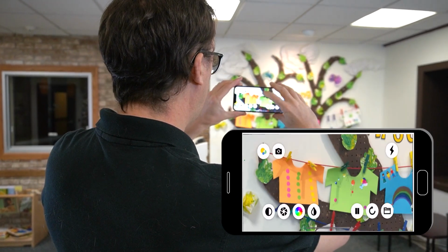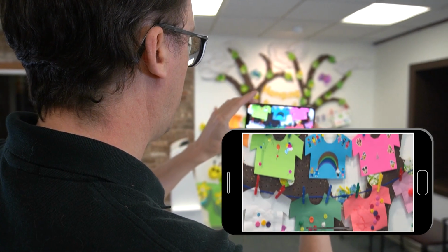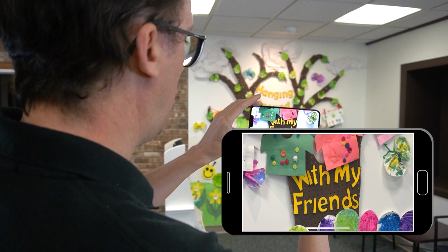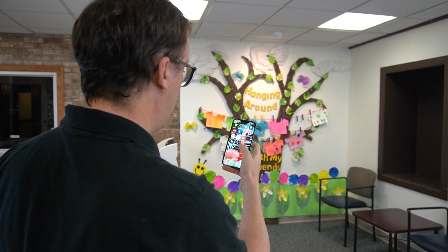Obviously, we can rotate the phone as well and get a kind of wider image, and that's probably going to be the best way to do this, I would have thought, whether you're reading up close or in the distance, because you are then going to fit more on the screen lengthways, which is kind of what you want, really. Let's check out the Magnifier app now.